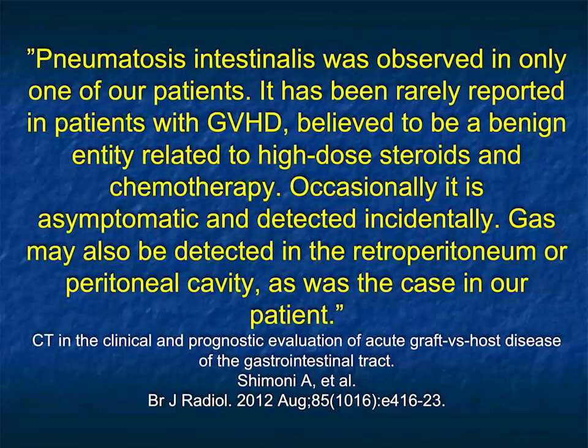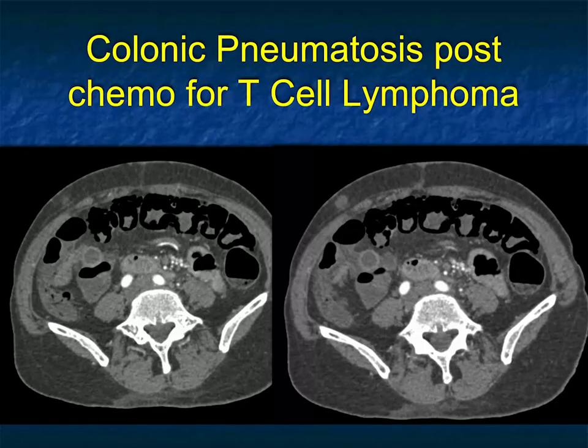Pneumatosis that we always worry about representing infarcted bowel or ischemic bowel, but in patients occasionally with graft versus host disease, it can be seen due to the patient's high-dose steroids and chemotherapy. So not every patient with pneumatosis has ischemic bowel.